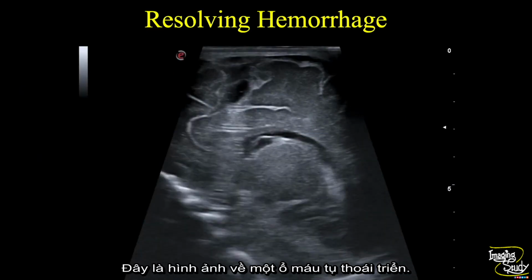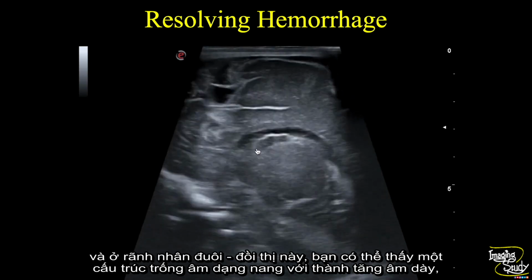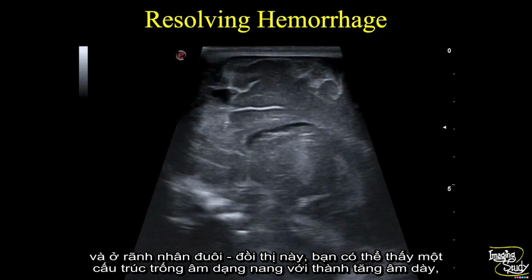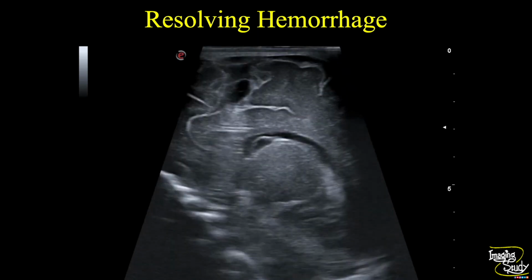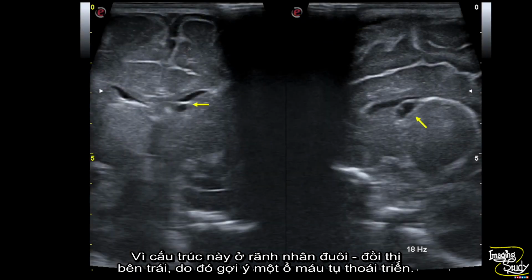Now what will happen if these echogenic blood clots get resolved? Here's a picture of a resolving hematoma. You see, this is the caudothalamic groove, and at this groove you can see an anechoic cystic structure with a thick echogenic wall. It is slightly elongated, not like a choroid plexus cyst. So this elongated cystic space at the left caudothalamic groove is nothing but the resolving hematoma.